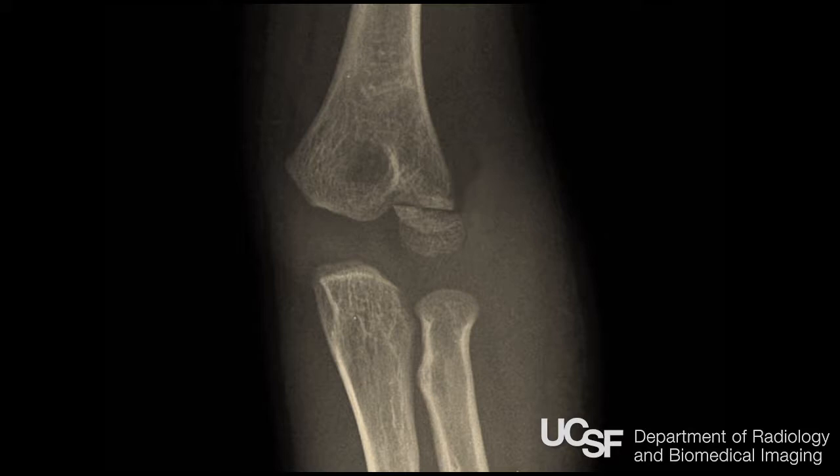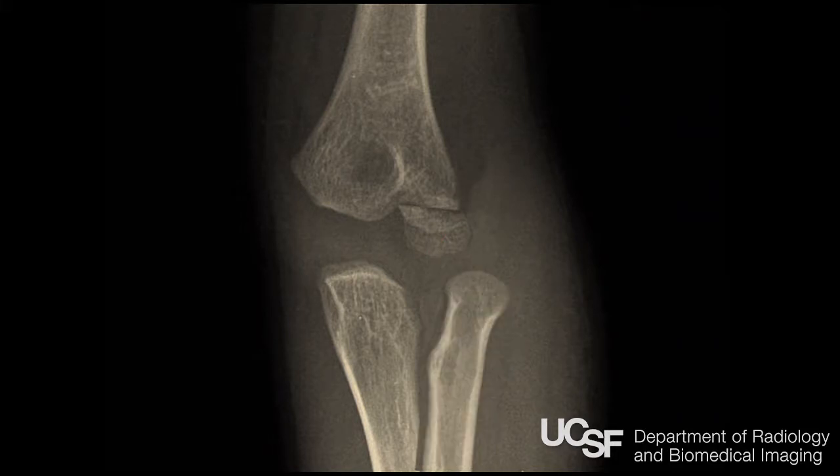Now, we have a number of things that could happen. One, if we draw the radiocapitellar line, which the radius should always line up with the capitellum no matter how you take the x-ray, and we do this, the radius is no longer lined up with the capitellum. So where is the problem? Between the radius and the capitellum. So what is that? A radial dislocation. Nursemaid's elbow. Okay, so the radiocapitellar line is not lined up.